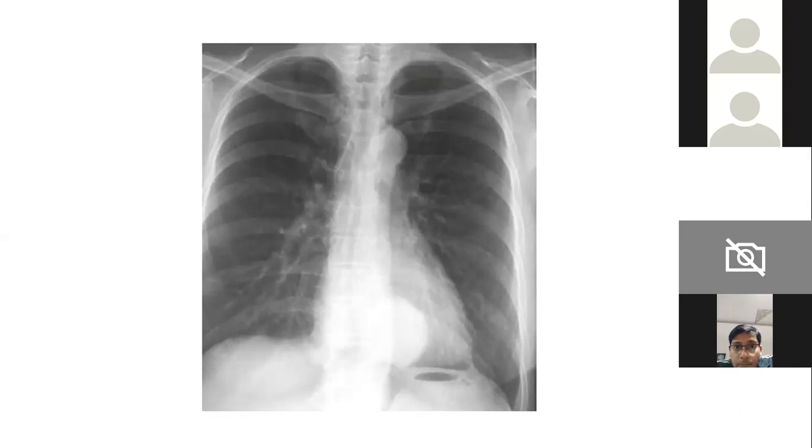So it is neither in the anterior mediastinum, right? The paraspinal line comes in the middle mediastinum according to Felson's classification. Sorry, the para-aortic line. The para-aortic line is in the middle mediastinum according to Felson. So this is not in the middle mediastinum also, likely to silhouette out the paraspinal line. So it is in the posterior mediastinum.